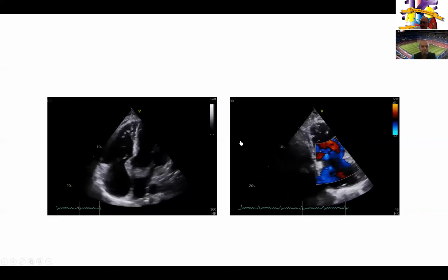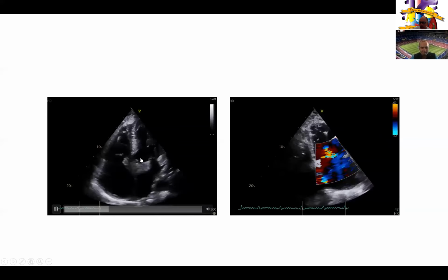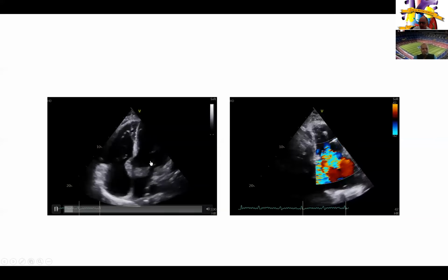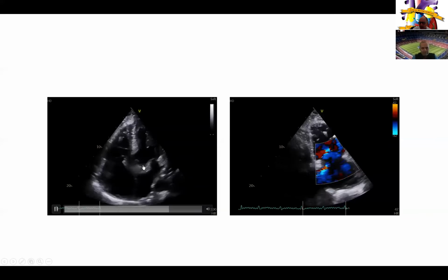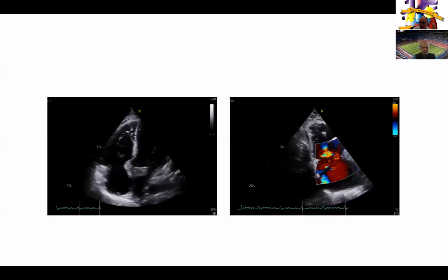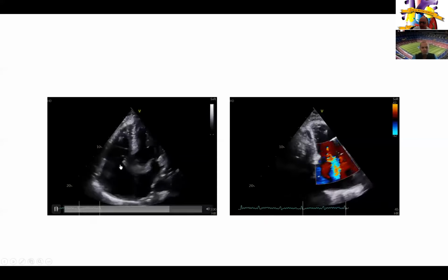Yeah, the only thing that's concerning for me is this area here in the 4-chamber or 5-chamber view, where you can see some thickening between the mitral, aortomitral curtain right here, all around this area. But again, it's just not clear to the point where you can say this is definite endocarditis. But there is some thickening there.